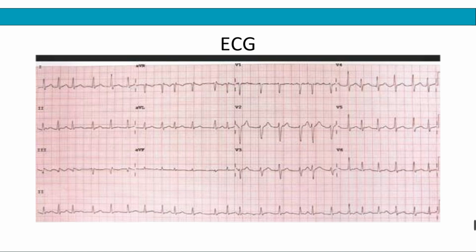And this is the ECG we've been given. Not very clear, but we'll come back to see if we can read it. But let's go back to the question to see if we can pick up some key information to help us answer the question.